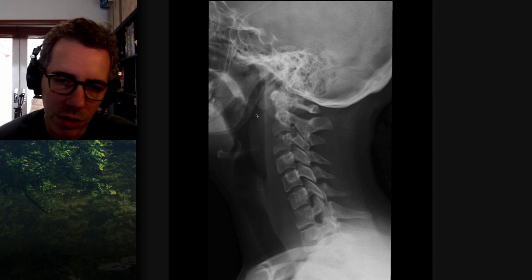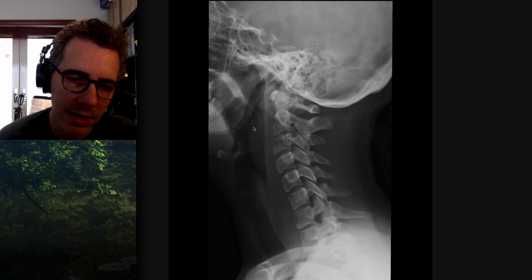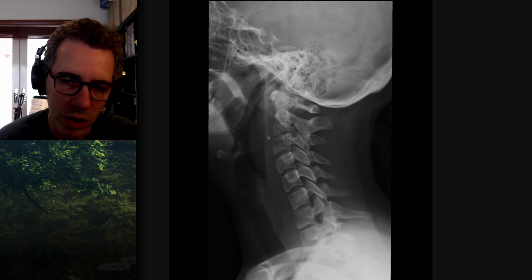So do you see this curved line bulging anteriorly? I think I've seen that a number of times in cases, and it's often not noticed. Everyone notices the closer straight line, which in this case is swollen, but it's not enormous. But that line there is another prevertebral soft tissue line that's just off midline or on one side.